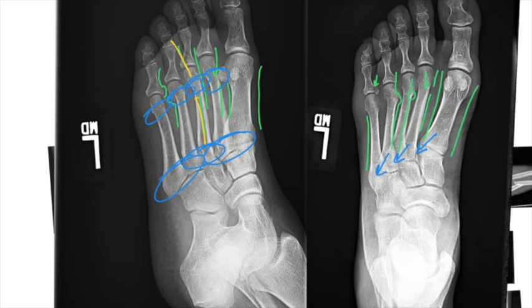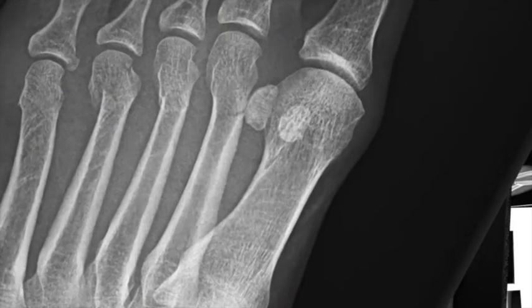By the way, don't forget the corners of your film. If you look down here, smooth, not smooth, and you've just identified a fibula fracture. Take a close look at this fracture line here, because this is the kind of fracture that is more difficult to pick up. What you're looking for in these fractures is a lucency that extends through the cortex. Depending on the view, you may or may not see the actual break or a discontinuity in the cortex, like you do here in this one. What you're looking for is that lucency. Now, if you look in other views, you might actually see a more clear discontinuity.